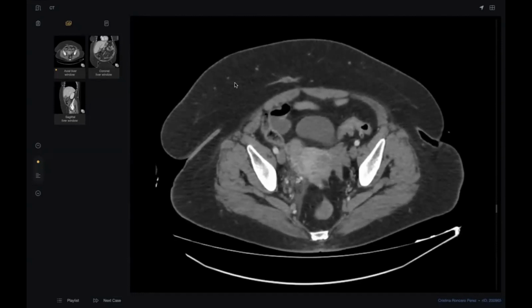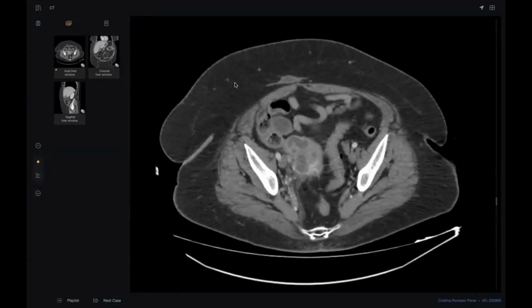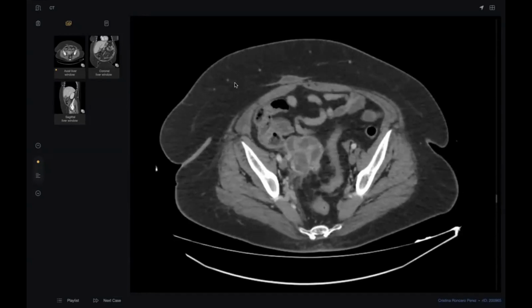Yeah, okay, this is the uterus, and I can see that there's a right adnexial complex lesion with peripheral enhancing wall and central multilocular low densities. I'm suspecting this is a complex right adnexial lesion, so I would like to check in the coronal view.